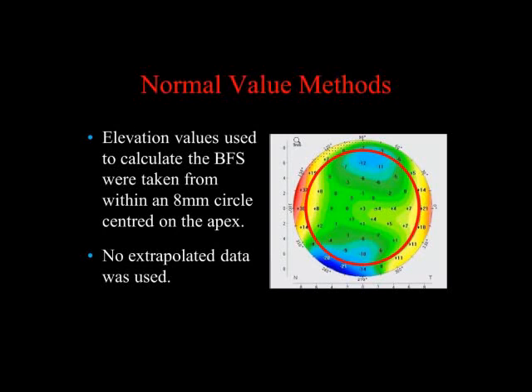The other one is because normally for rapid screening, we just display 9 millimeters. It's easier to look at the maps. And this is the area for the 8 millimeter. And we tell our technicians, I don't want to see any extrapolated data. And sometimes you'll see little peripheral. So we chose close to 90% of the 9 millimeter zone to ensure that we're using non-extrapolated data.